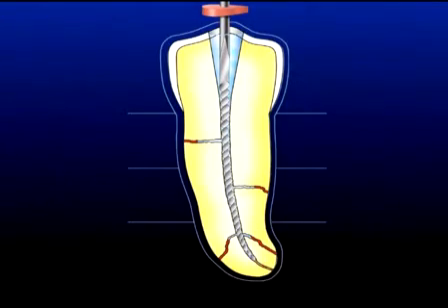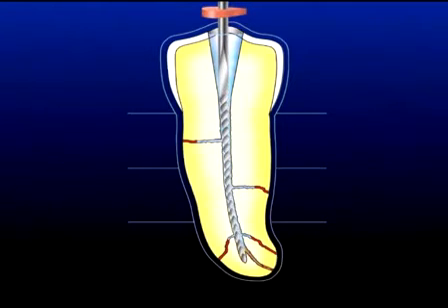Generations of dentists have been trained to work short of the radiographic terminus. Every dentist who has worked short has experienced the frustration of an apical blockage. A loss of working length occurs due to the compaction of collagenous tissue apically and/or the accumulation of dentine mud. In the instance of the lost foramen, many clinicians become frustrated and aggressively attack the obstacle, which serves to inadvertently condense and pack debris apically.